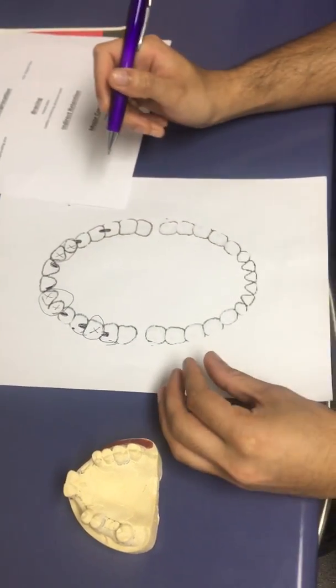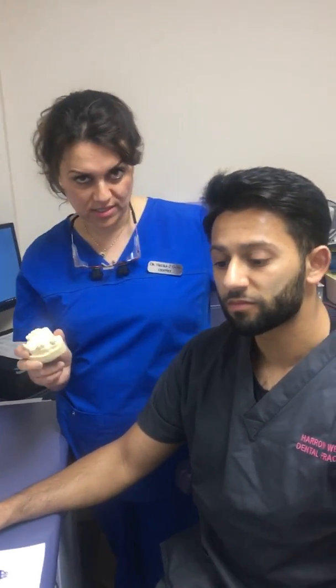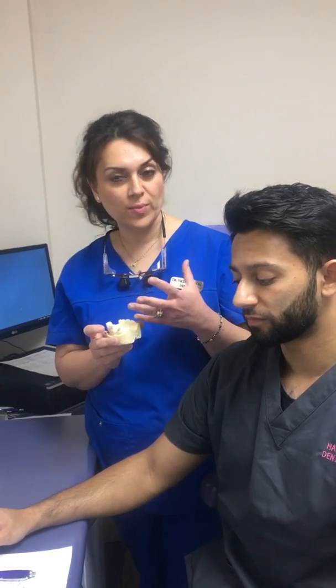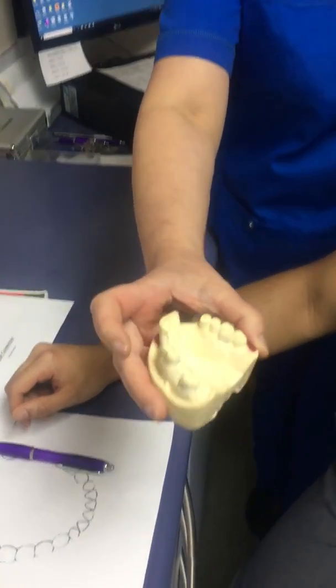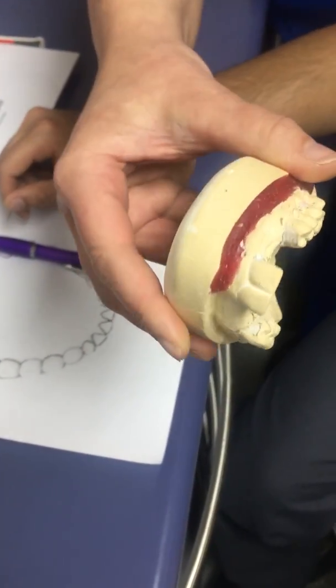Can I just stop you at this moment? I think we need to tell the listeners that at this stage, Nikhil has taken primary impressions of the patient's teeth. He has asked the technician to survey the model, and once you survey the model, you can identify your undercuts, your guide planes, and points where you could put your clasps. And what the technician has nicely done is blocked off the undercut. So if the camera comes close, you can pick up where all the white plaster's been placed, where the undercuts have been blocked, and also where the survey lines are, where the clasps can potentially be placed.